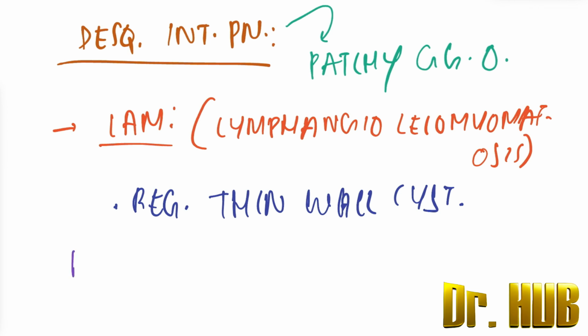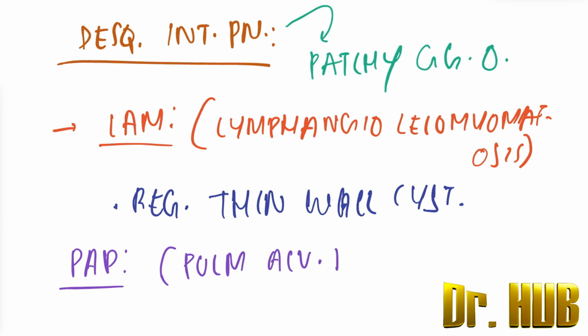Next we look at the PAP. What is meant by PAP? PAP stands for pulmonary alveolar proteinosis.